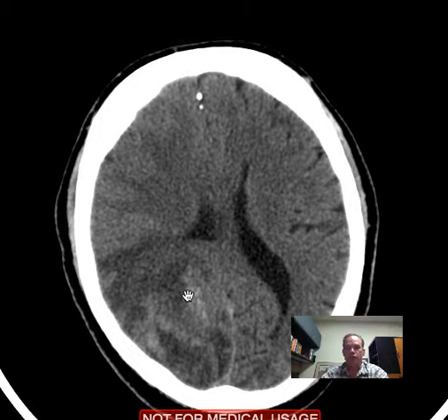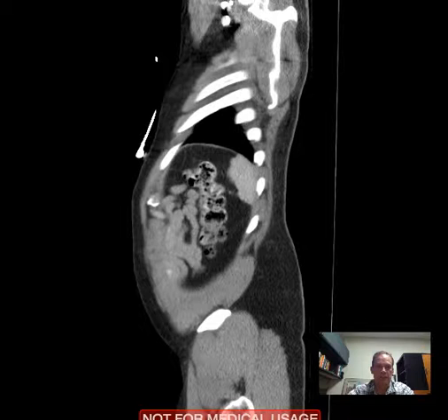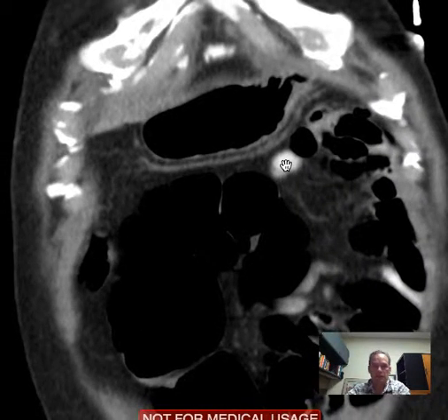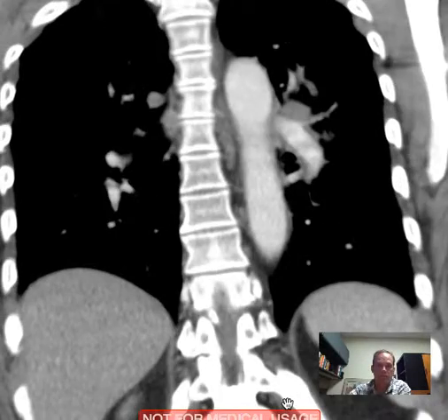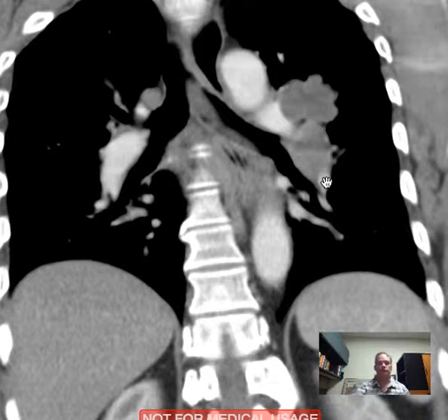But we always are suspicious whenever anybody comes in and they have a first diagnosis of a brain tumor, and if there's any chance it might be a metastasis, we immediately think of lung cancer. So we go, let me size this down and bring it down, and here is the chest CT. Very impressive abnormality in the left hilar region.